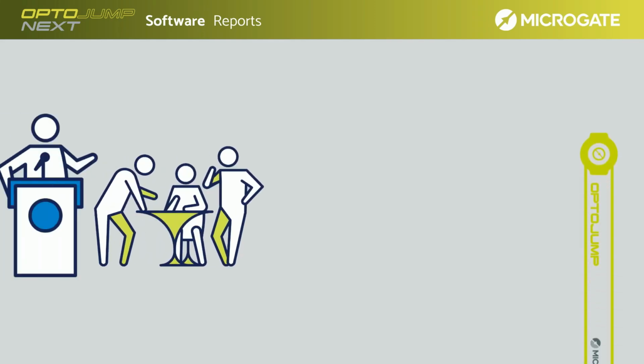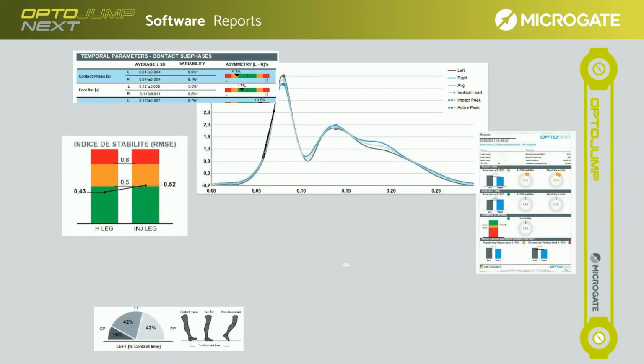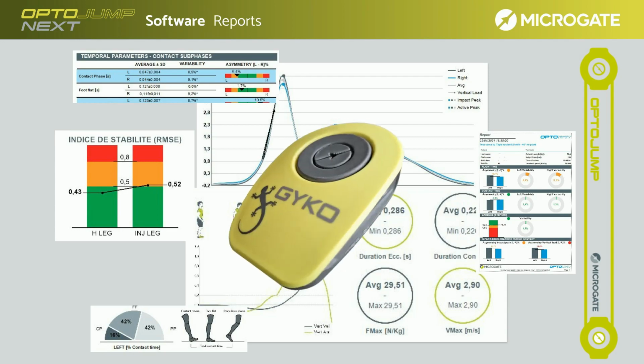Thanks to the collaboration with experts and scientists of the sector, we have included for the different types of movement new interesting parameters, mostly coming from the integration of the inertial sensor.